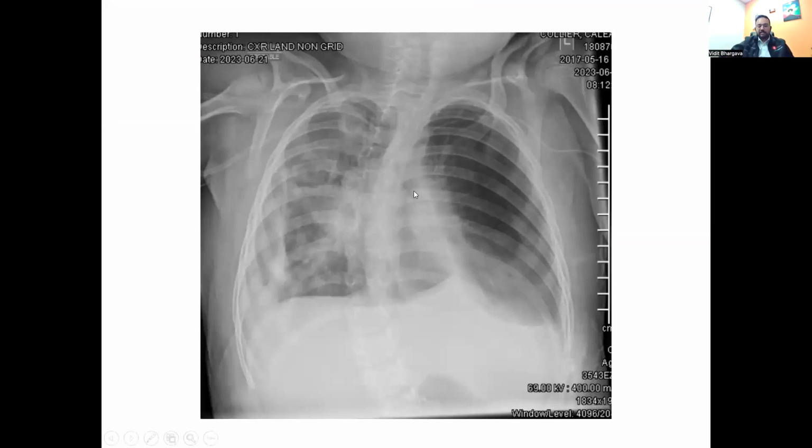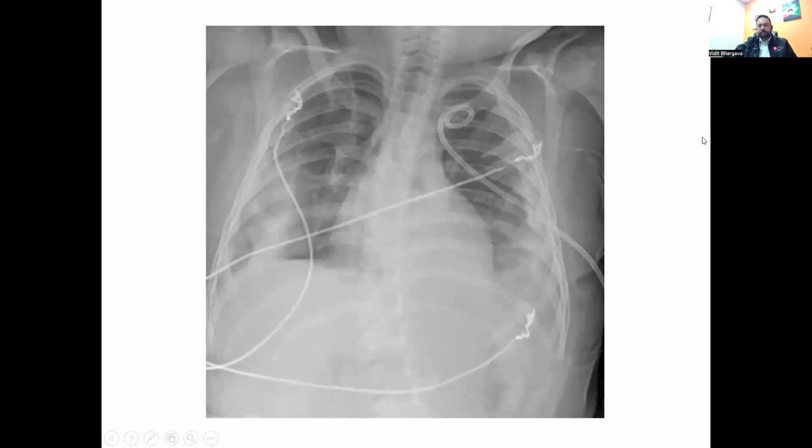And so this was the chest X-ray that was obtained after we got the ultrasound images, which showed a pretty large pneumothorax, which would explain why the pleural sliding was absent in both anterior and lateral lung zones. A pigtail catheter was subsequently placed, and that caused pretty quick resolution of that pneumothorax.